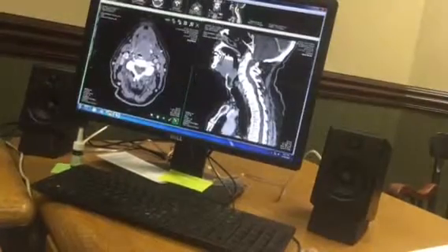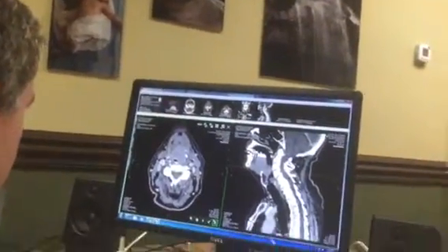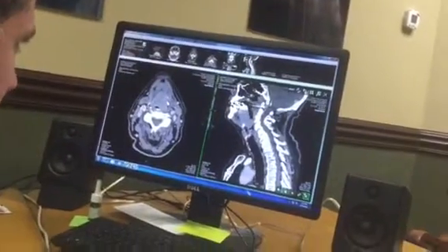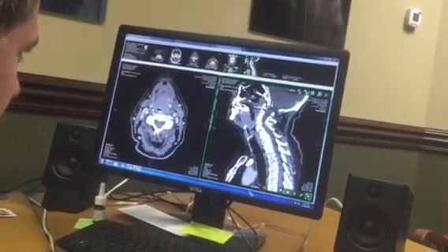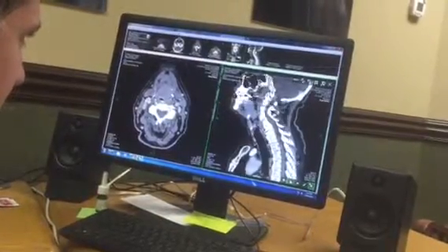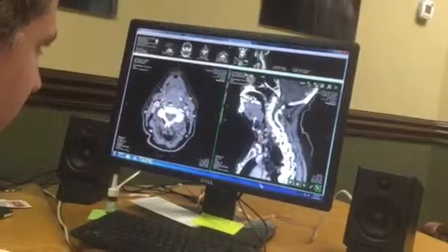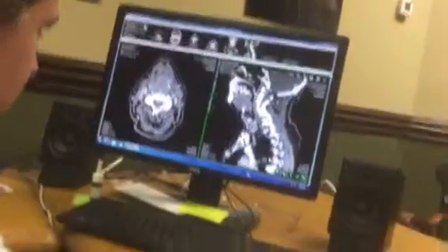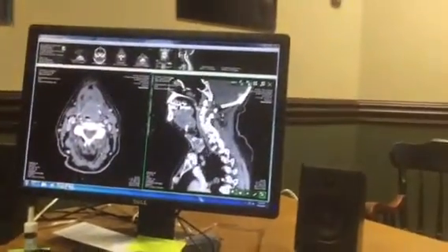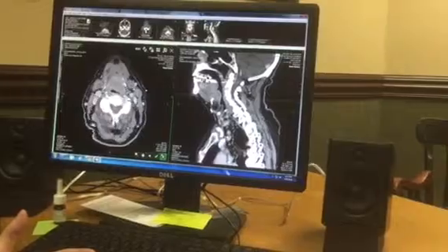It's just I can't really tell where the tumor starts and stops. It looks a little diffuse. You see on this sagittal view here, it's like a big thumbprint. You can see it's right in the middle of it on that slice. And it's kind of full. Again, that little hump, it's right there. Yep, right there.